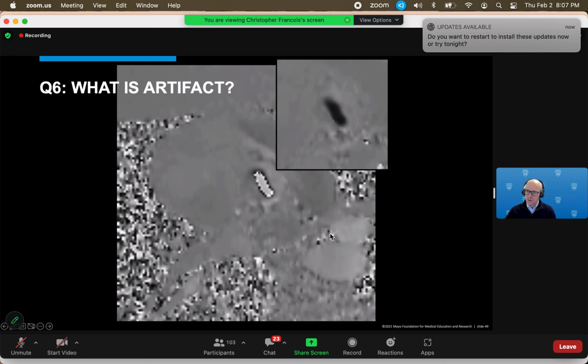If you look at the difference between these two images, the other thing I would like to point out is that white and black do not necessarily mean forward or backward. It really depends on how you set up your acquisition. If I just rotate my field of view for this acquisition, what is black would become white, or vice versa. So you can't really rely on the color of the signal to decide whether it's forward or backward flow.